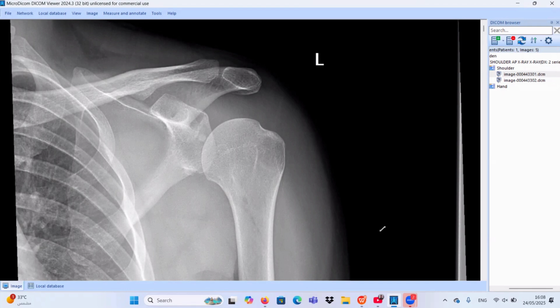Thank you. Can we localize the fracture that you picked up? I think this one. This part. Yes, sir. Okay, that's good. And I think this is the defect of the bone. This area. It is considered a subtle abnormality, but it's present. And considering the history of the patient, you should search for any bony fragments along the inferior glenoid articular surface. I think you have here some sclerotic margin, maybe an impacted cortical defect at this area. It may represent Hill-Sachs or not. I'm not sure. Let's go.